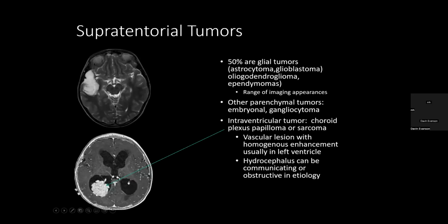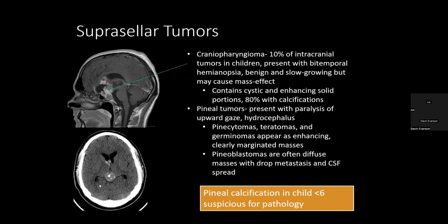So intraventricular tumor here, again from RadPath, this would be a big one. But you see the complication causing hydrocephalus there. The suprasellar tumors, differential for that, age is important.